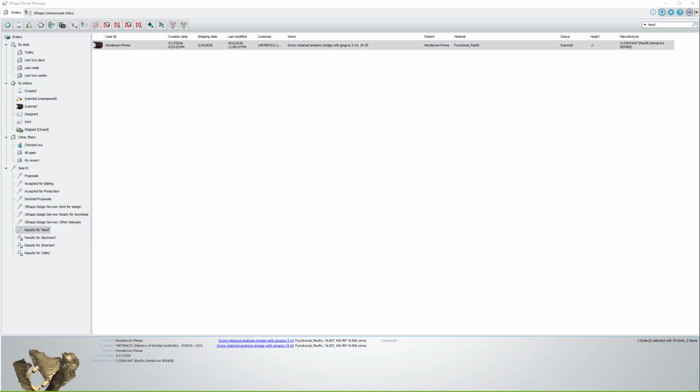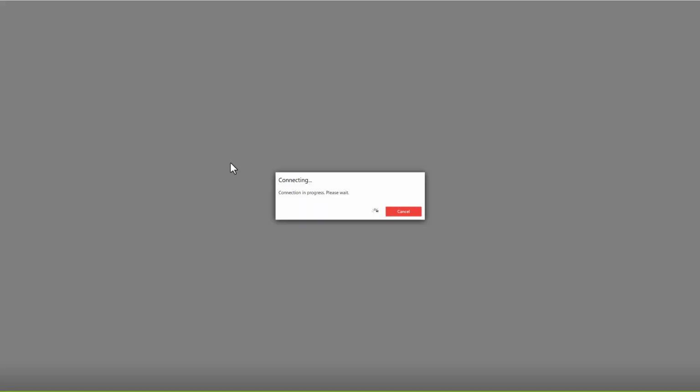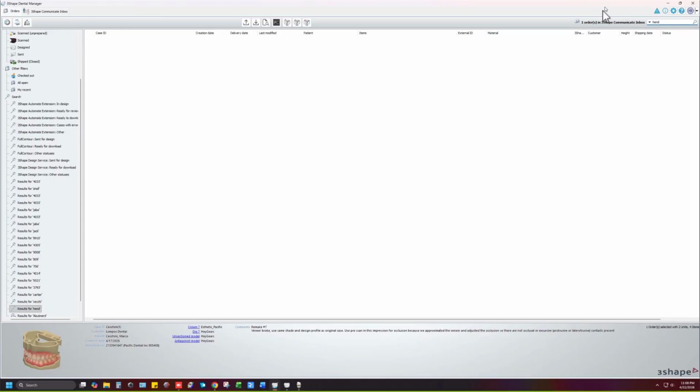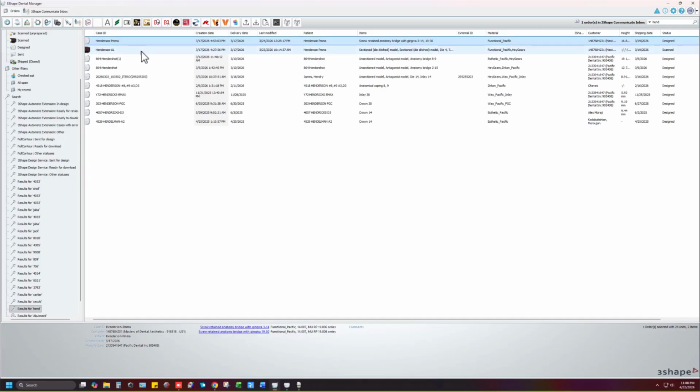Now let me quickly log in to my computer at work, and I will show you. Here we go. Now we have this is the final case that we designed.